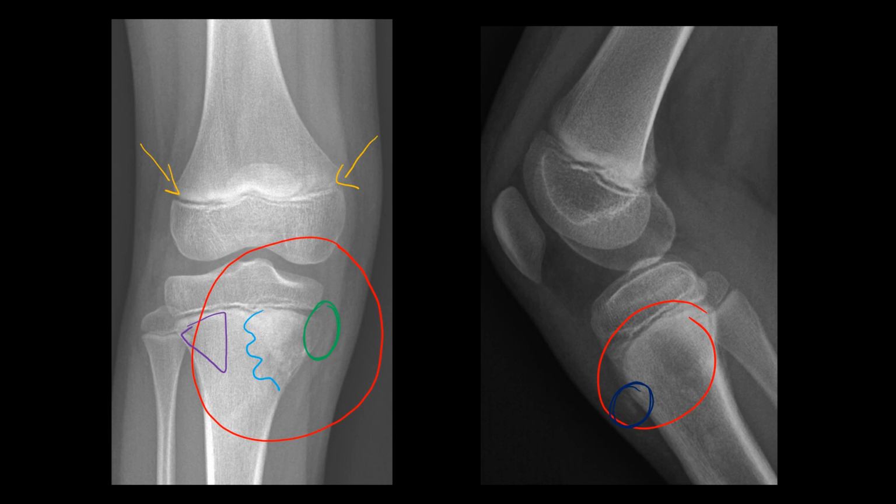A young patient, pediatric, aggressive lesion. Even without looking at the images, you should always think about osteosarcoma or Ewing sarcoma, osteosarcoma being more common. And you see this bone production or osseous matrix, and you should favor osteosarcoma. And this is a classic osteosarcoma as seen on a radiograph.